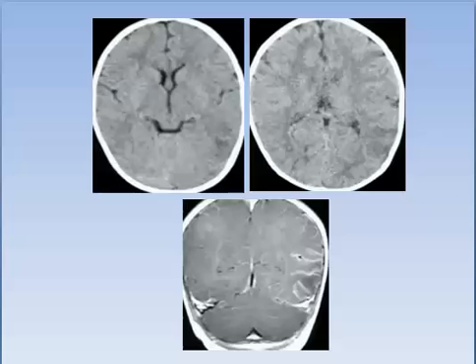Diffuse types are also seen, and we have here definite meningeal involvement, meningeal hyperemia with enhancement.